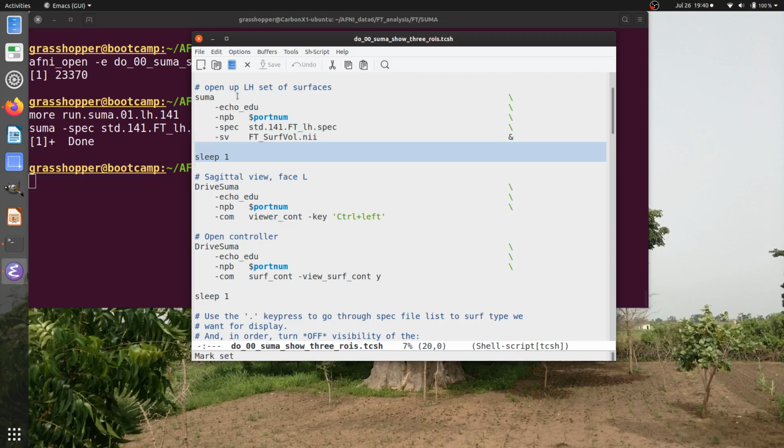For more complicated things being done, sometimes it's good to add a little delay before you do another command, just to make sure, or to have a better chance that the initial one finishes. So that's what these sleep commands are for. This is a sleep for 1 second.